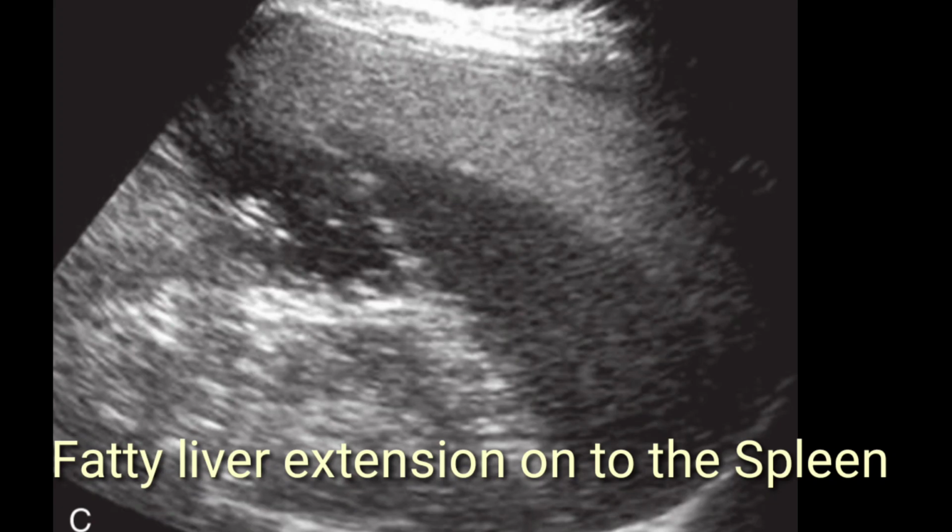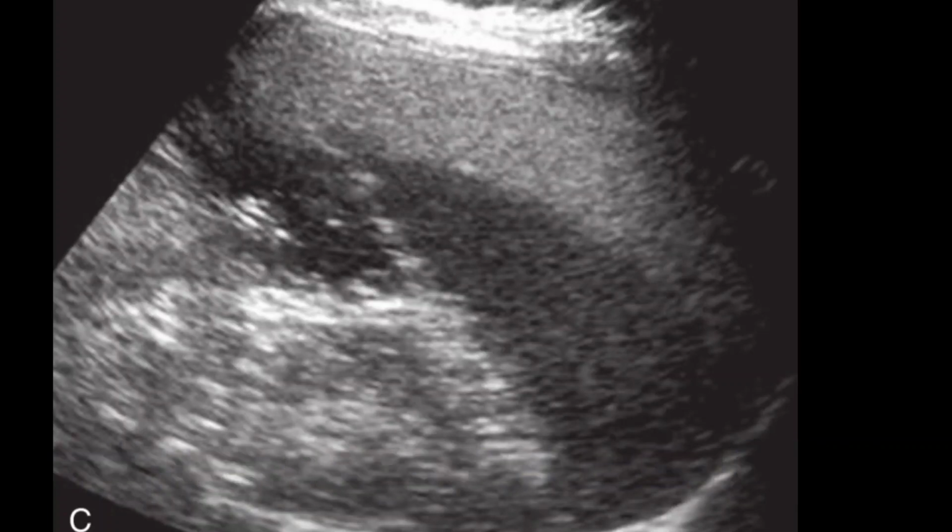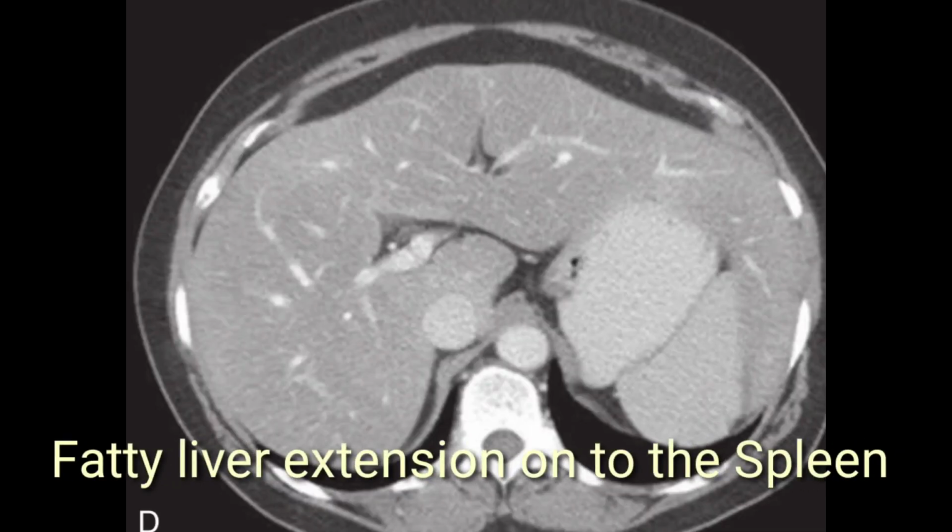As the liver is more echogenic, the spleen comparatively looks hypoechoic. So the relationship of the spleen with a normal liver and an enlarged fatty liver has been discussed in these slides. For better understanding, a CT image has been included to see the status. On the CT image, the liver and its intraparenchymal vasculature are clearly visible.